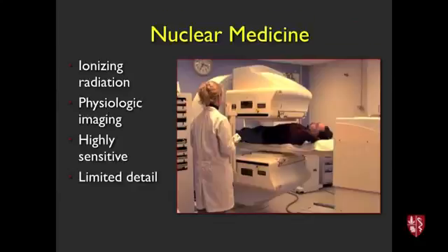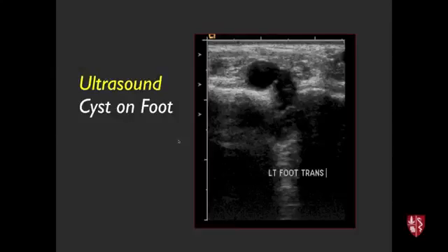The shadowing, obviously the density on ultrasound implies that this is a fluid space, but does the shadowing tell you something different about whether or not you're going to encounter a solid versus a fluid? It can, and in cystic structures, like fluid-filled structures, they have something called through transmission.